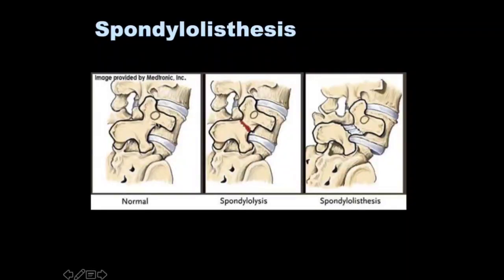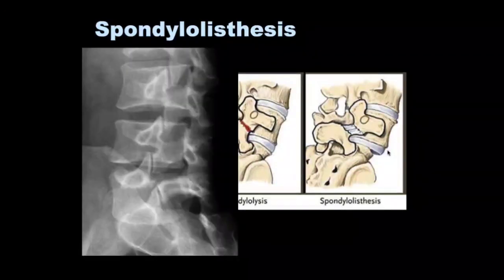So this is the pars interarticularis. This is sort of an oblique orientation. If there is a collar through the dog, then obviously it is spondylolysis, and if there's a big collar, then it is a spondylolisthesis, and there will be sort of abnormality of the alignment of the vertebra. Important thing to put in the report, because that in combination with a degenerative disc disease can cause neural compression.